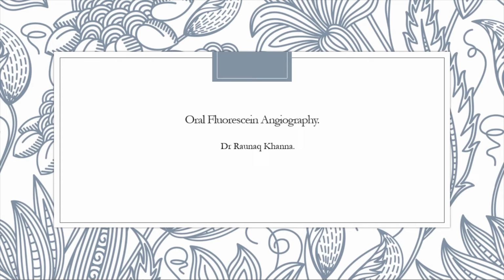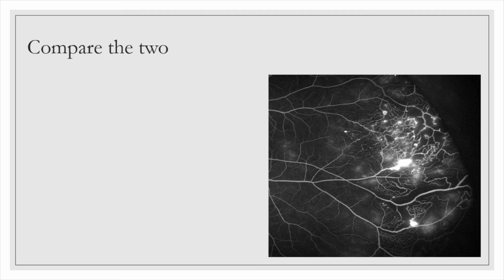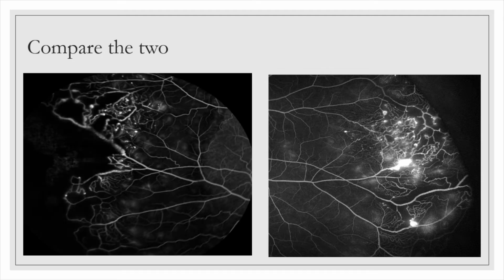Good evening, everyone. Today I'm going to be talking about oral fluorescein angiogram. So let's start with a little bit. Let's try and compare these two images. I'm not trying to ask you what findings there are there. Let's just compare them in terms of quality and if the vessels are delineated and the contrast. Is there a stark difference between the right and the left?